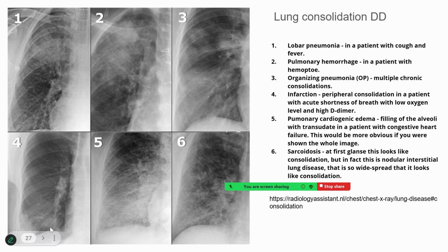As you see over the lower lobe, there is opacity, and that opacity has resulted in a relative gap between the thoracic cage and the pleura. This is suggestive of either an infarction or a fibrosis, which results in what looks like a consolidation. Consolidation can also occur due to vascular edemas, like cardiogenic pathology.